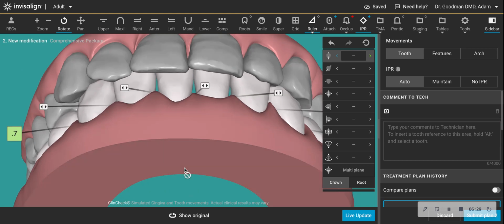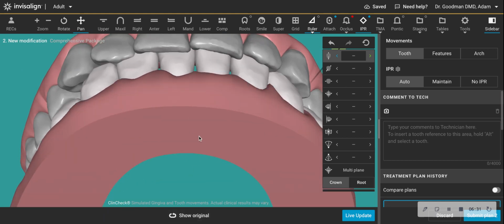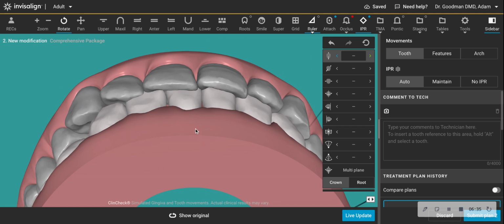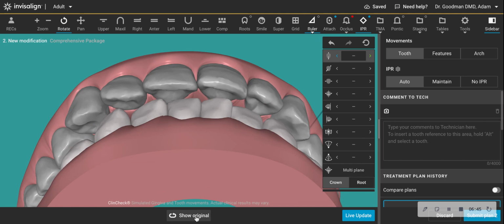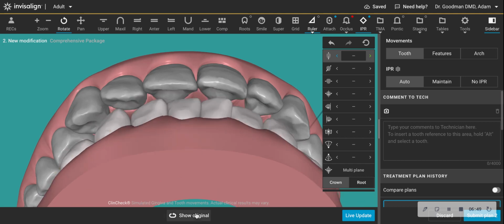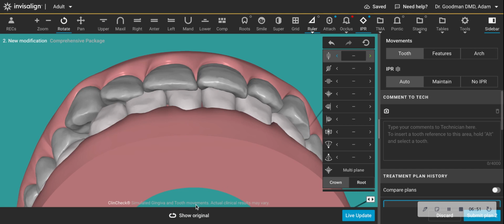And by the way, even if I were to reduce that spacing, I think you'd see the same issue. Okay. Now I can go ahead and line up the upper anterior teeth, and I'm going to have a more accurate read on what the overjet reduction would be. But I left them there so you could see the difference. If you remember in the beginning, you did not see the lower incisors come forward, but they will come forward. And if the aligners don't have that programmed, it's going to lead to poor tracking and possibly other side effects that you don't want to see.